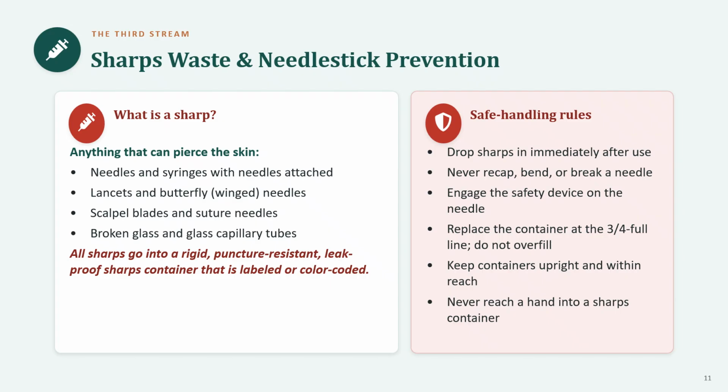Engage the safety device that is built into modern needles. Watch the fill line and swap the container when it reaches about 3/4 of the way full because overfilling means sharps stick out the top and someone could get stuck. Keep the container upright and within arm's reach, never on the floor. And never ever put your hand in a sharps container to push things down or fish something out.